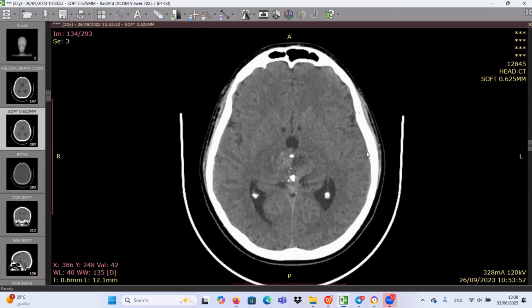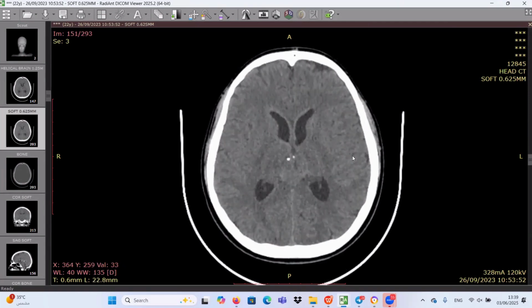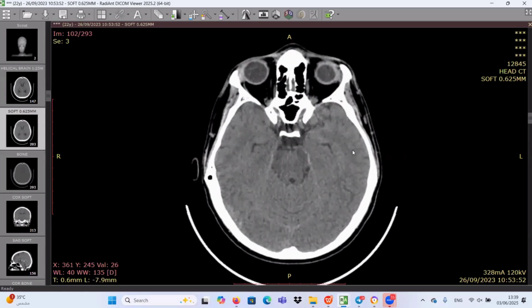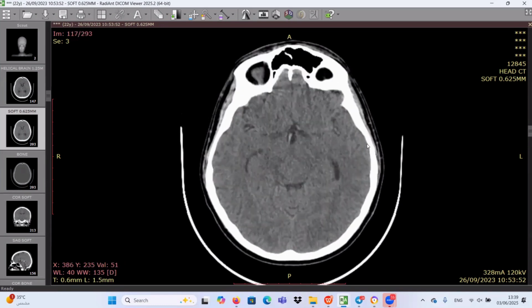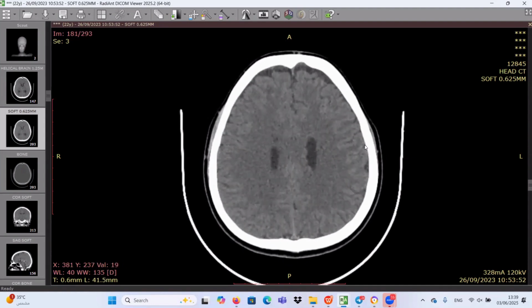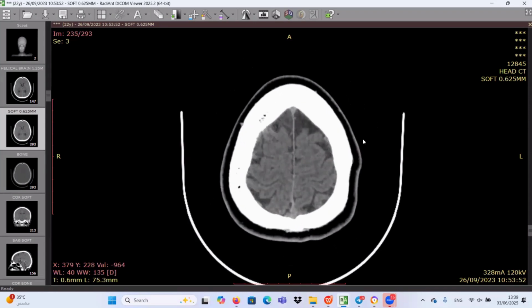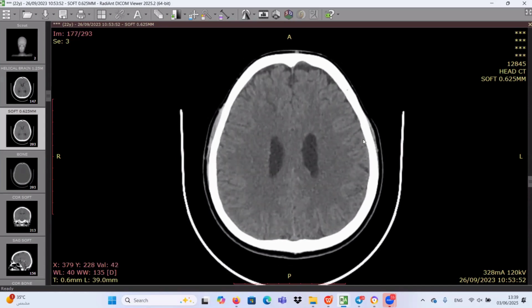In this non-enhanced CT scan of the brain, axial cut, there is a well-defined lesion involving the pineal gland area. There are multiple foci of calcification centrally located within the mass lesion, which appears to be of heterogeneous density and is causing mild prominence of both lateral ventricles and the third ventricle as well. I want to correlate with the post-contrast study as well as the sagittal cuts to confirm the anatomical position of the lesion. In correlation with the patient's age, young male, I'm thinking about pineal gland germinoma because of the pattern of engulfed rather than burst-out calcifications.